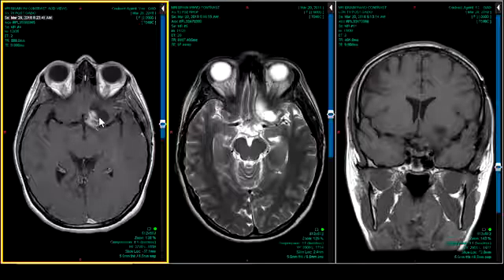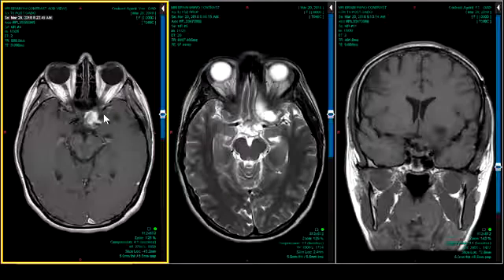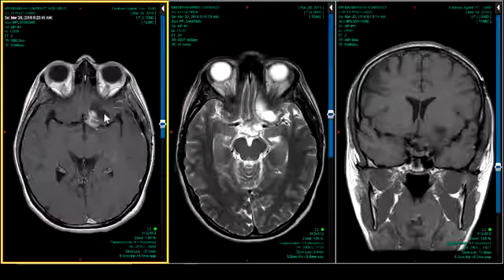Another mass that is cystic that will have some nodular enhancement is the PXA, the pleomorphic xanthoastrocytoma. These may have a little bit of high signal on T1 without contrast. They are also associated with some mild dysplasia in the neighborhood, and they're low-grade lesions. So that would be a lesion that's in the differential. They can have nodular enhancement in funny places. They kind of like the periphery of the brain more than this lesion does. So that would be one consideration.